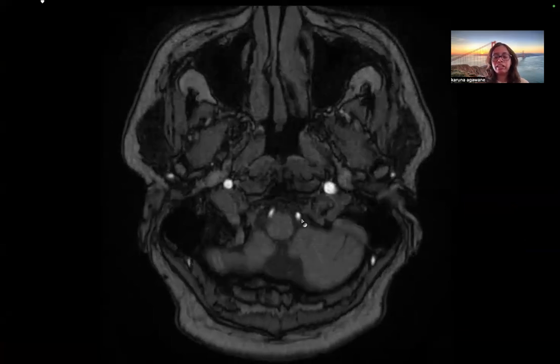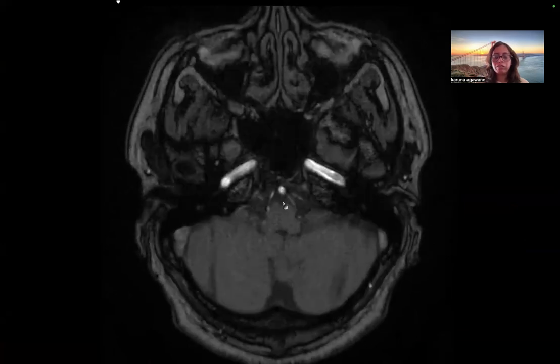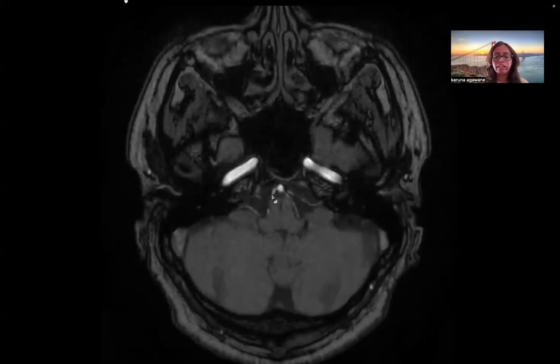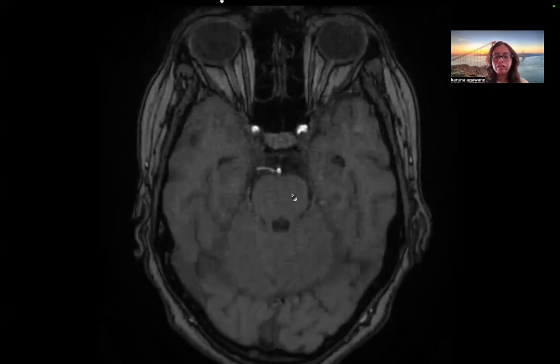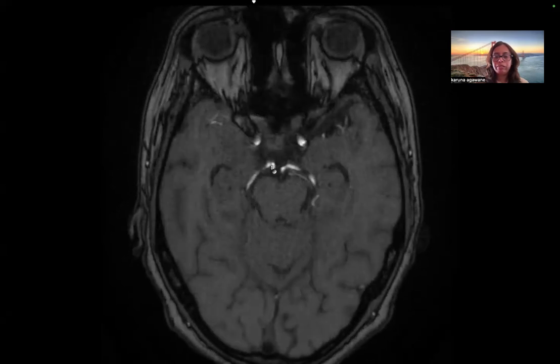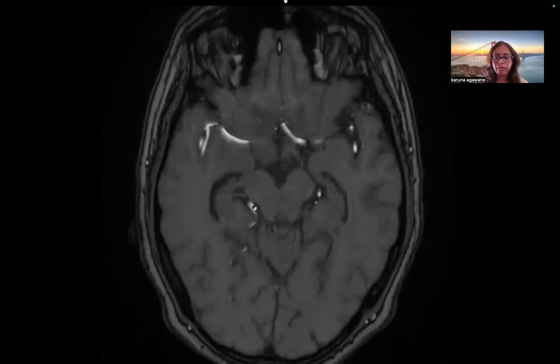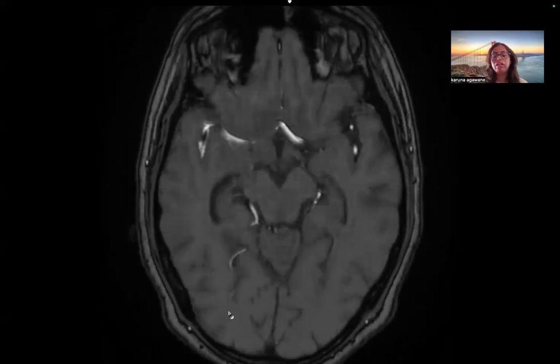These are the basilar arteries. Here is the confluence of the, sorry, my mistake. These are the vertebral arteries. Here is the confluence of the vertebral arteries forming the basilar artery. These are the anterior inferior cerebellar arteries. Then coming upwards, it gives off the superior cerebellar artery on both sides. And then it bifurcates into the PCAs. Then this PCA is the P1 segment. Then here is the P2 segment. Then coming off here is your P3 and peripheral P4 segment.